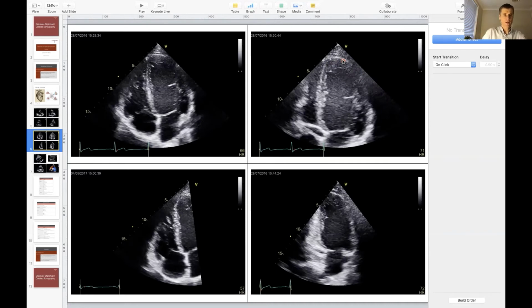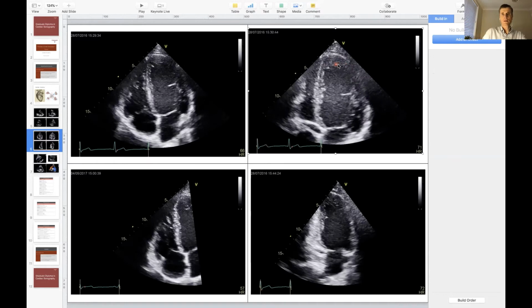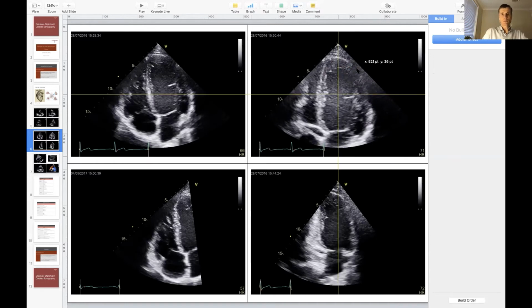So, for example, if there was a lesion in the left anterior descending coronary artery, which typically supplies the apex of the heart, and the apex of the heart is formed by the left ventricle, you may well see impaired motion in this particular part of the heart. And so it's important to be able to describe that, which is where you would start using terms such as apical.